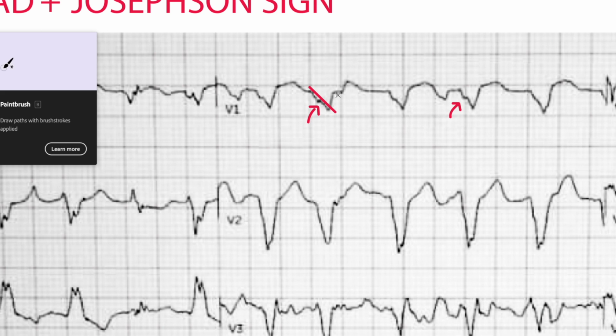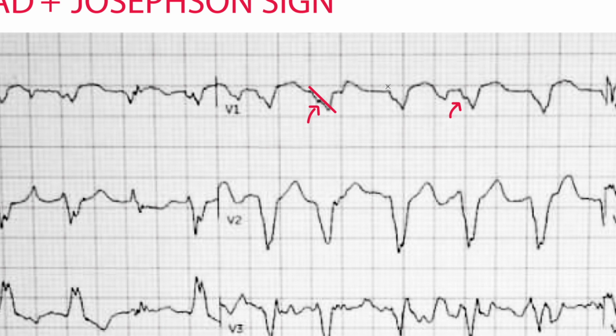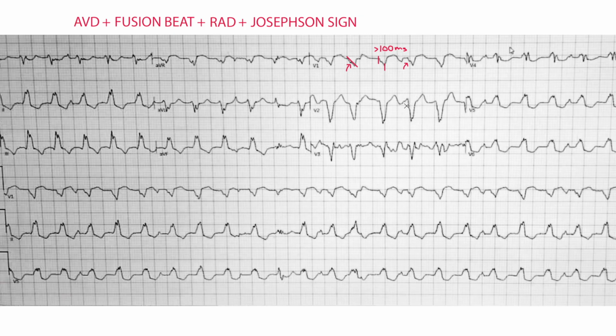Another thing we can pull off of the Brugada criteria is, well, let's see what I can use here. We'll use this. When you measure the onset of the QRS to the nadir, or the peak of the S wave, if that distance is greater than 2.5 small boxes, so if it's greater than 100 milliseconds, again, this is another sign which favors the diagnosis of ventricular tachycardia. This right here is known as the Brugada sign. So this is one of the criteria that I just kind of pulled out of the hat quickly.